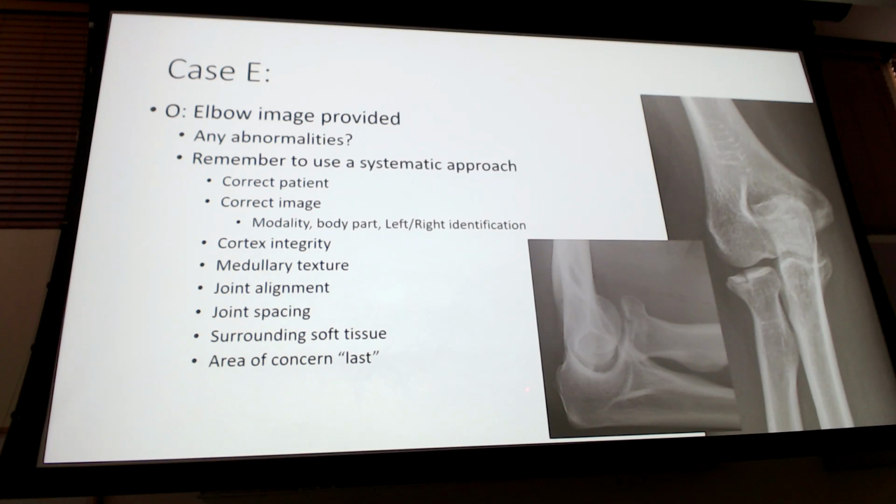Small little fleck right there. Does everybody see that? And the answer to that is I don't know. It could be a small avulsion. It could be the start of maybe osteophyte kind of starting to form and going to come together due to arthritic change or something like that. There is a small little fleck right there. I don't know what that mechanism of injury is. So, good eye.